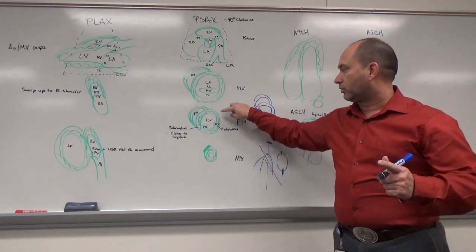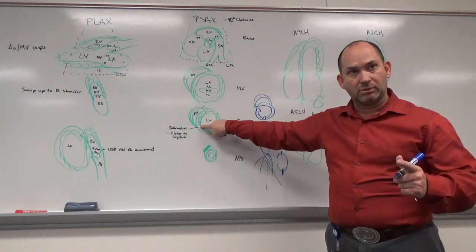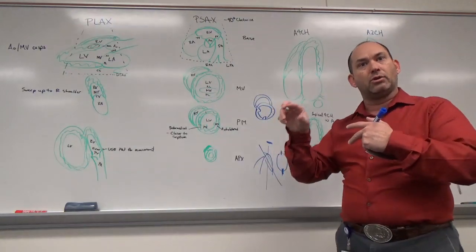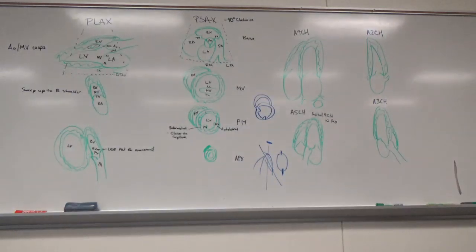This is anterolateral, anterior septum, inferior septum. Okay. So it's either an inferior or an anterior, and then it's either a septal or a lateral or just anterior or just inferior. So it's actually a little bit easier to learn than it used to be. I know it doesn't make sense. It could be, technically, posterolateral. Right, technically the same. That's what it used to be, posterolateral.